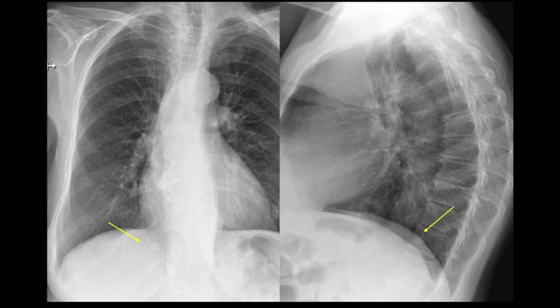Here's an example of a nodule which is projecting below the level of the diaphragm. Notice how it's sharply demarcated, indicating it's surrounded by air. This corresponds with its more posterior location because this is where lower lobe exists. And we can see how it's projecting below the diaphragm on the lateral radiograph. Just emphasizing that we should be scrutinizing behind the diaphragms in addition to over the cardiac silhouette in many locations that can hide lung lesions.